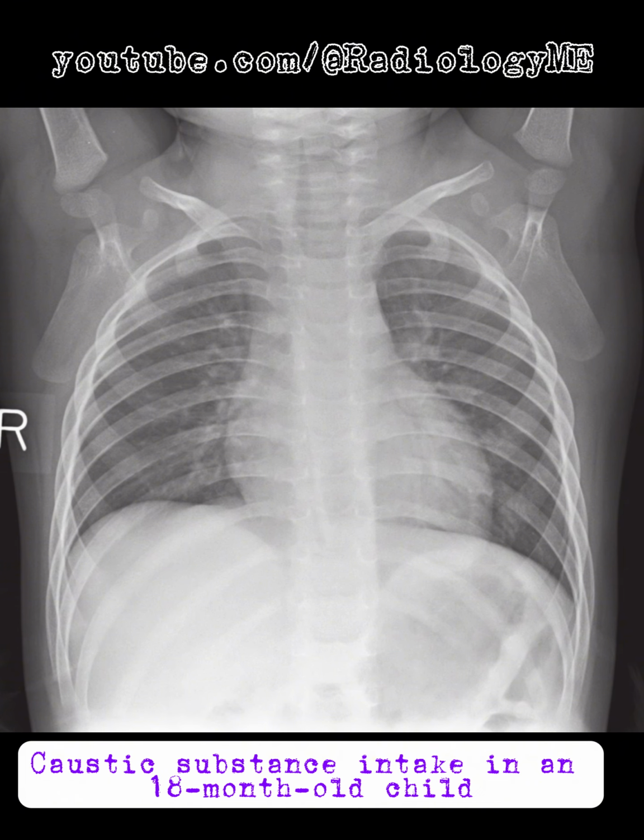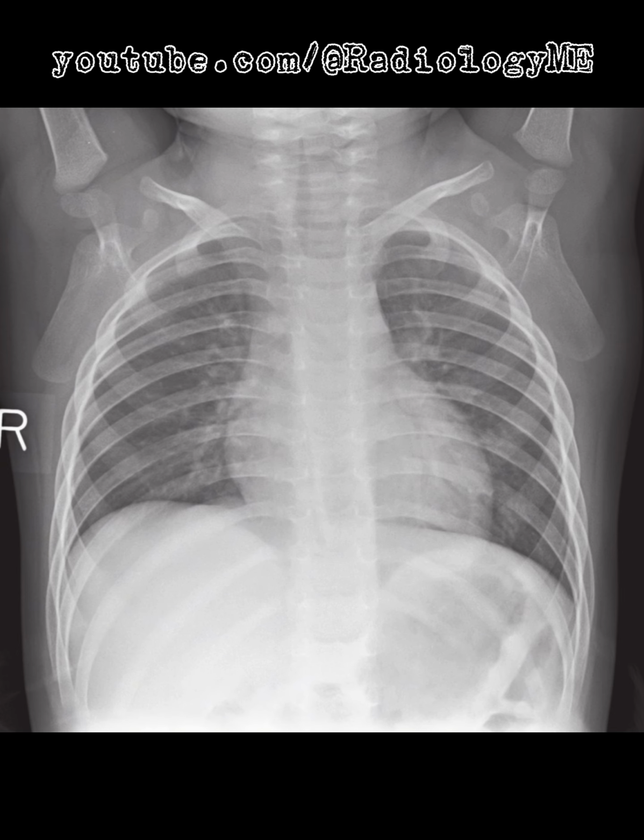Additionally, I'm seeing bilateral central peribronchial thickening and some parahilar infiltrate. Despite these findings, the lung volumes are well preserved, and there are no other abnormalities that stand out. If there's a history of viral illness, then croup is the most likely diagnosis. However, we also need to consider other possibilities like epiglottitis, which is more urgent and can require immediate airway management, or perhaps ingestion of a caustic substance.